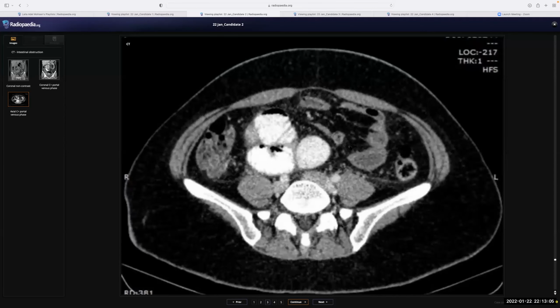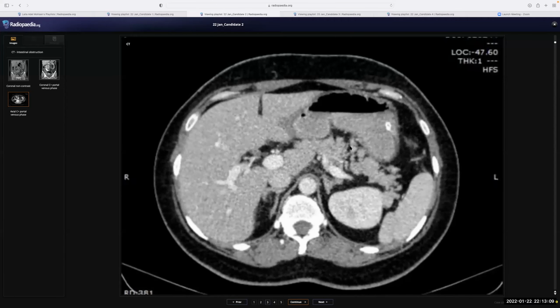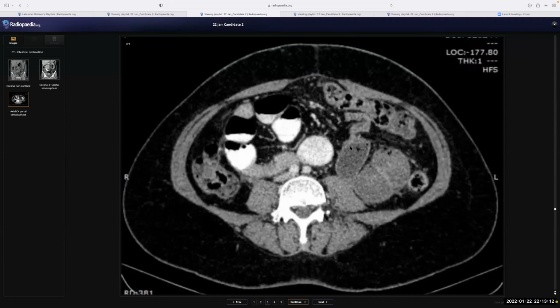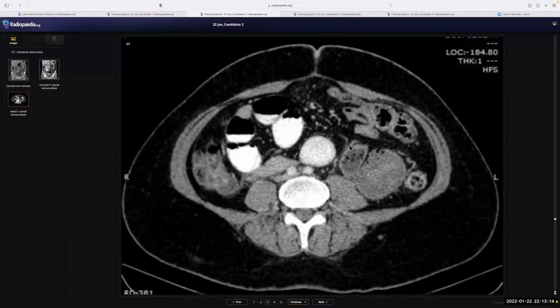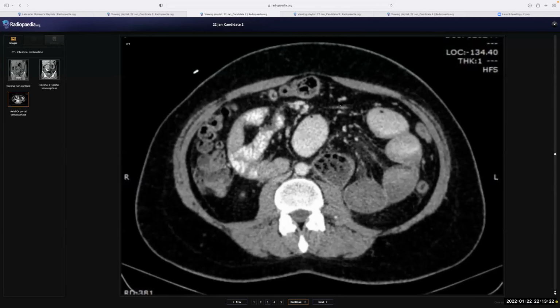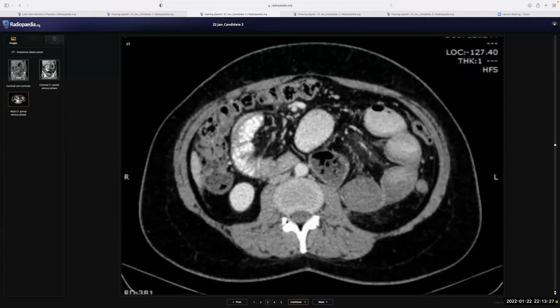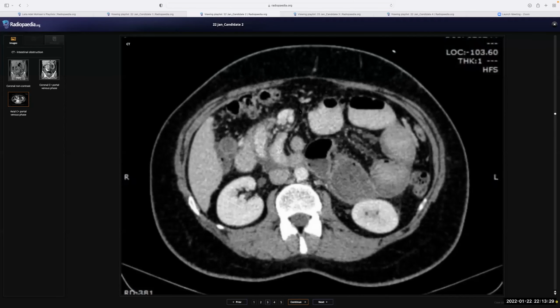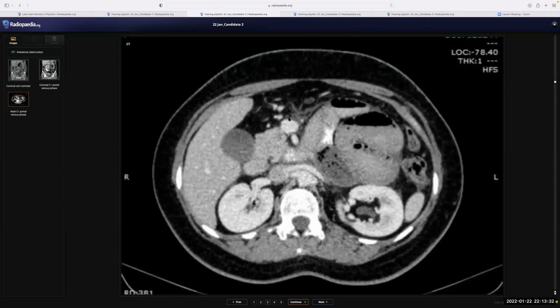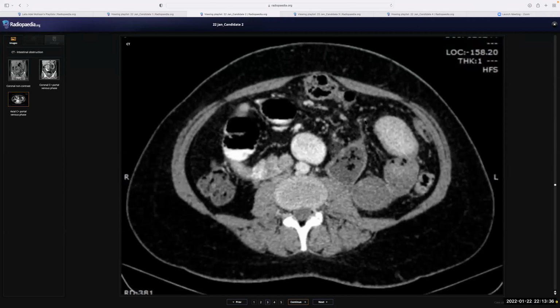How to know a left paraduodenal hernia? You look for the inferior mesenteric vein. This is the inferior mesenteric vein. So the left paraduodenal hernia, because always the dilated loops are behind the inferior mesenteric vein, and if we can see, it's joining the superior mesenteric vein. Yes, this is one. That's the most common anyway. Yeah, the most common type. Right.